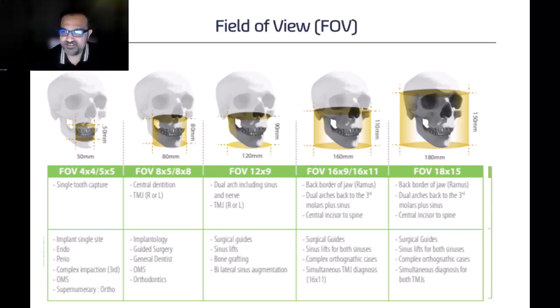Absolutely. So as you mentioned, Jim, thank you. The field of view, it's pretty much defined as I mentioned, the size of what we're about to take, we're about to image. And it's the diameter into the height. So on the screen, you can note that it's a cylinder, which is capturing the maxillofacial structures. So it's either represented in millimeters or in centimeters. So if you look at the top right portion of the image, you'll see the 18 by 15, which is quite a large field of view.